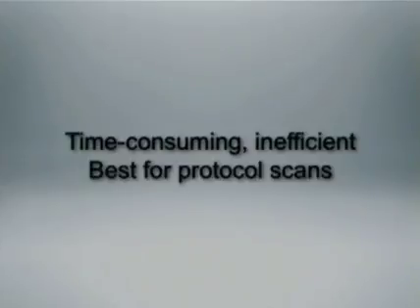However, this workflow can still be used for what I call protocol scans, where like in CT, you always want to do the same type of post-processing every time, and you could do it efficiently. But for the type of scan where you have a volume and you just want to explore it and figure out what structure is connected to what structure and figure out what's going on, it really doesn't work well. It's inefficient. So the third way of doing this is on the PACS.